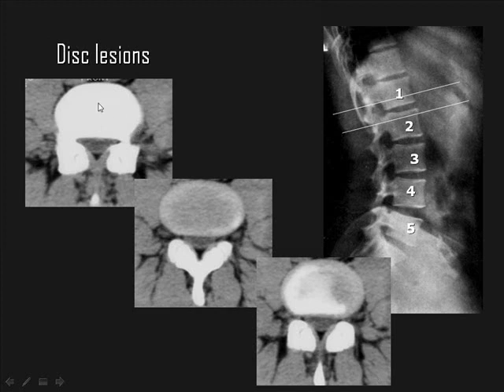Then you should select the soft tissue window images for evaluation. Then which of these images is suitable for assessment of the disc? It is the section that has passed exactly in the disc. How can you know the section that has passed exactly in the disc? By comparing the density of the disc with the density of the paravertebral muscles. Because the disc is a soft tissue structure, the muscles are soft tissue structures, then they almost look similar.